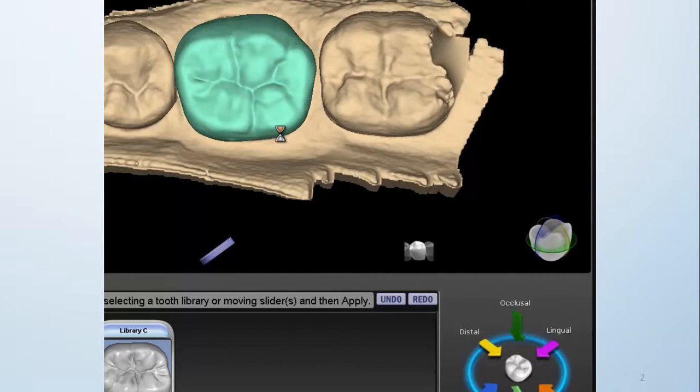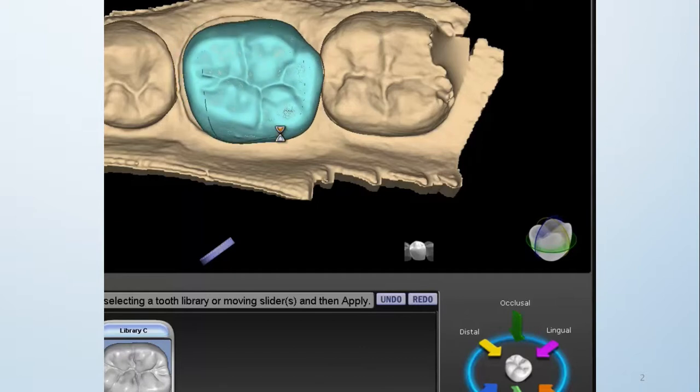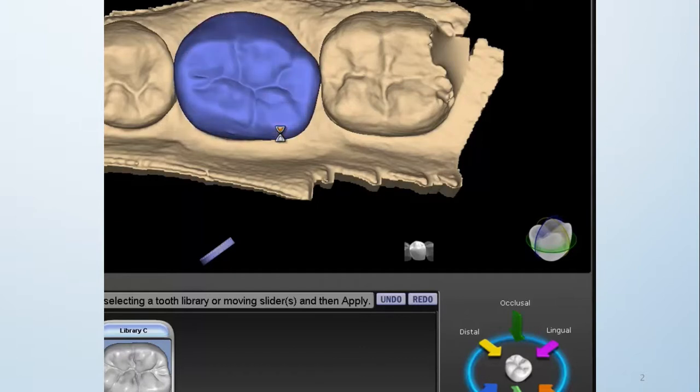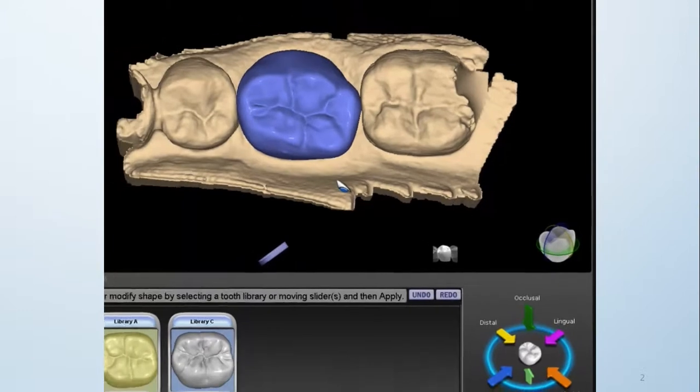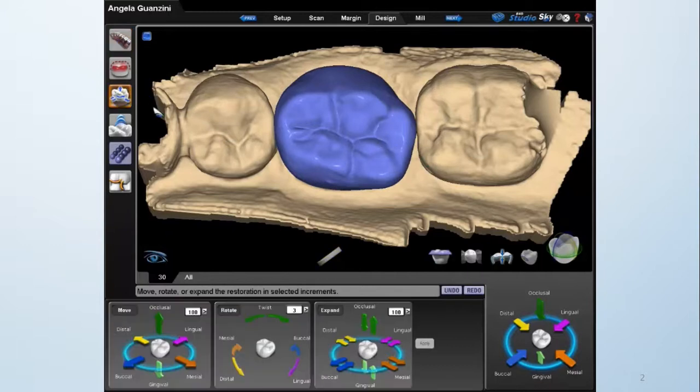After we press the apply button, we're going to watch the tooth morph, and then we're going to get into the design gone wild. So what I did with this case is I purposely over-articulated the case with this model because I know it happens where we run out of real estate, we just can't get enough reduction, we might get a really bad proposal on our occlusal table or material thickness issues, and that's what I want to talk about. I also want to talk about, take a look at that occlusal groove.